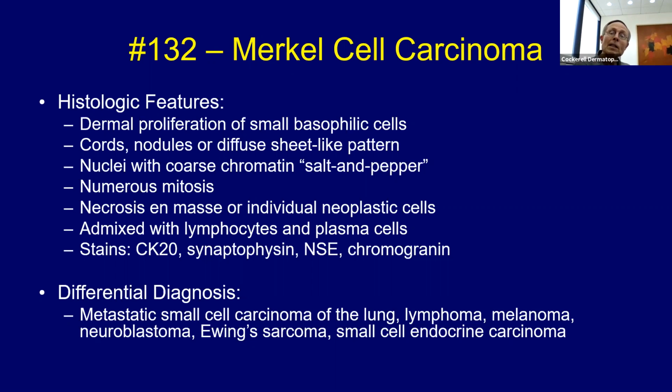And so would we always get a TTF1? Well, never always, but yes, we usually do. Most of the time, we do get that. So it's helpful when it's positive, especially in a pattern like this.